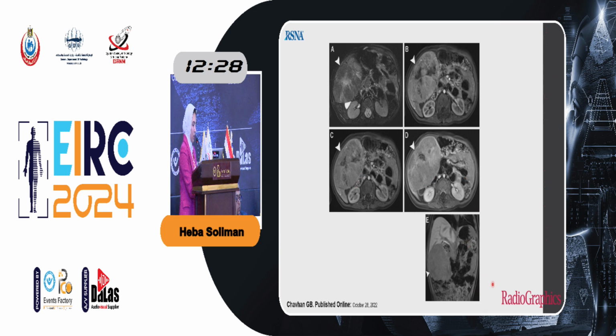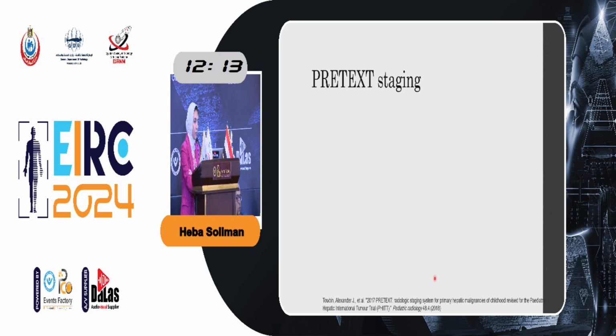And this is a case from the literature, injected with a hepatospecific agent, showing the lack of contrast retention by the hepatoblastoma, which is characteristic for hepatoblastoma with hepatospecific agents. Unfortunately, this type of contrast is unavailable in Egypt.